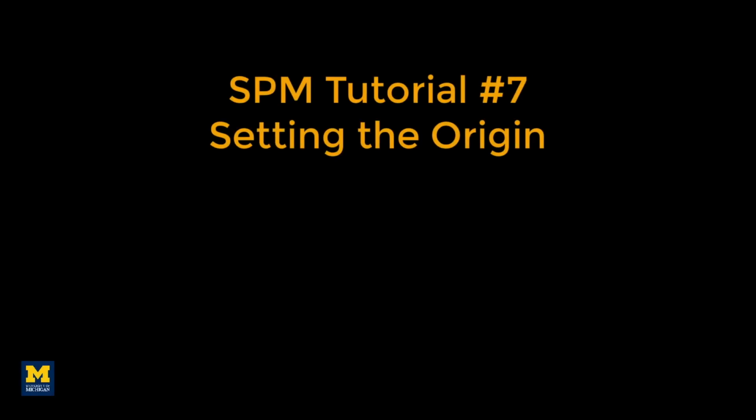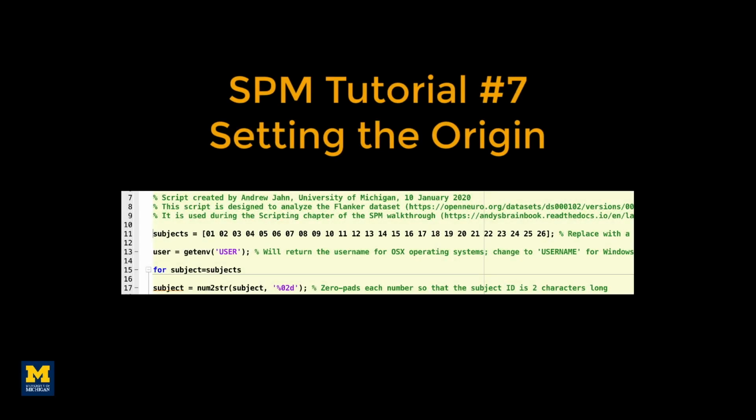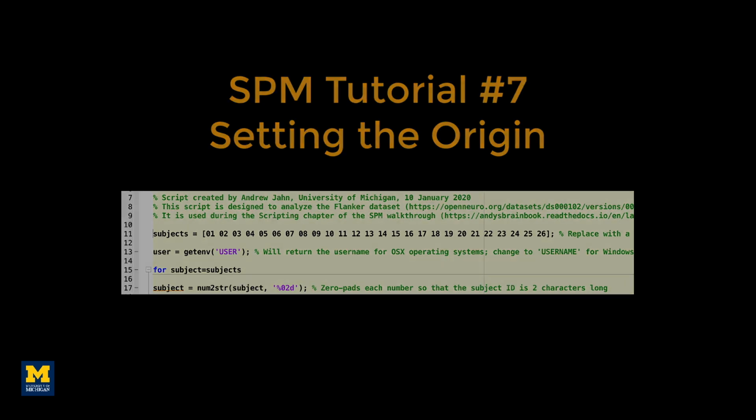After we scripted our analysis, it seems that all we need to do is run the script for all of the subjects. Before going on, we will check whether there are any errors for the two subjects we analyzed using the script. If there are, we can fix them early on.